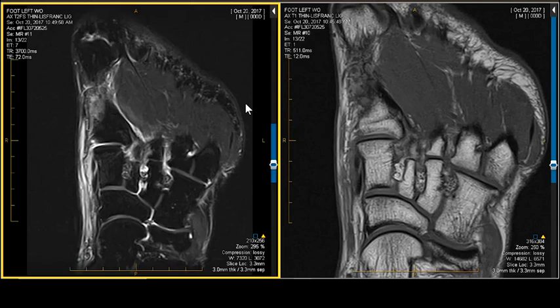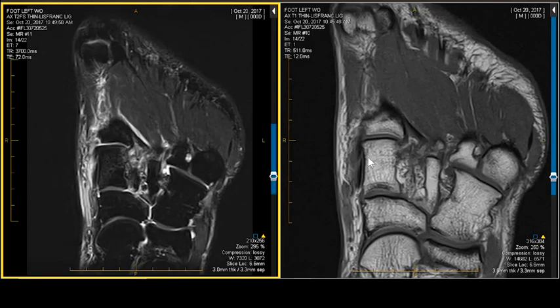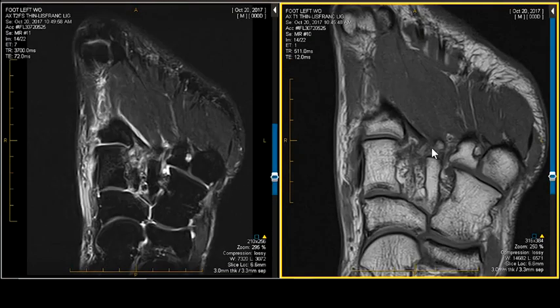But let's check out our plantar ligaments. I'm not sure what even to call them. I would call them ligament soup. Can we even spot a linear, smooth, black anything? No. So the plantar ligaments are gone. Do I care whether it's C1M2 or C1M3 or both? At this point, no, I don't care.